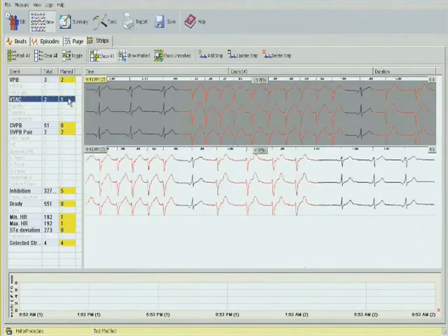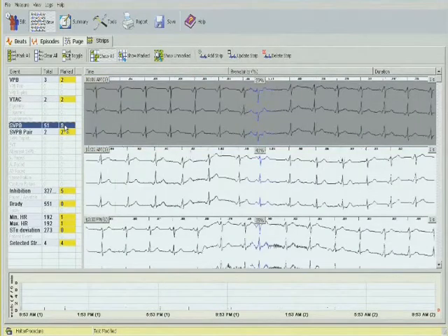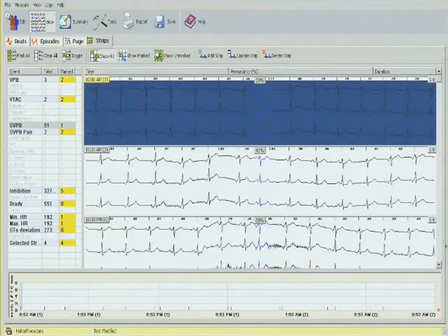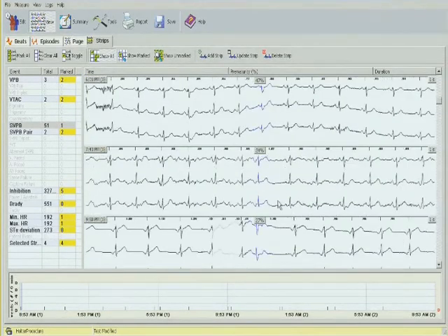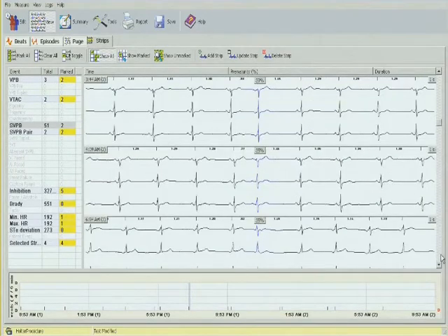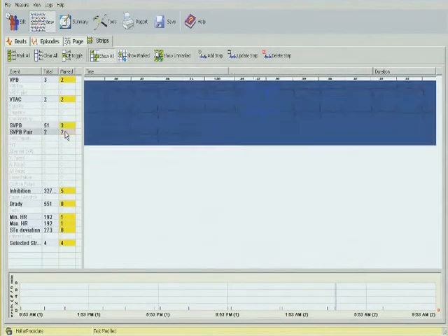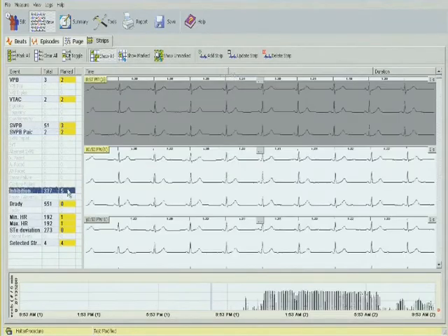Moving on to ventricular tachycardia, 1 run is showing. I want to show both of them. Same thing, just spacebar. A couple of supraventricular beats. Let me go page down, pick another one from somewhere else. Two atrial couplets, these are already selected for us. Inhibition, we don't need any strips for that. Clear.